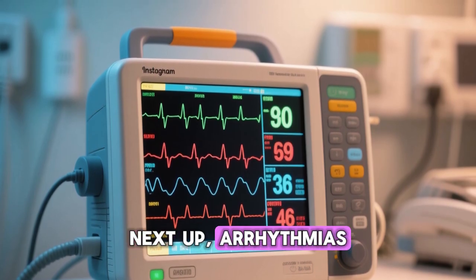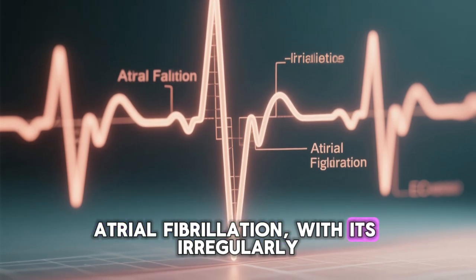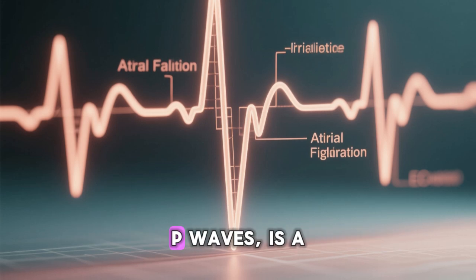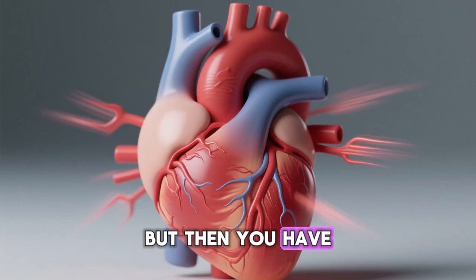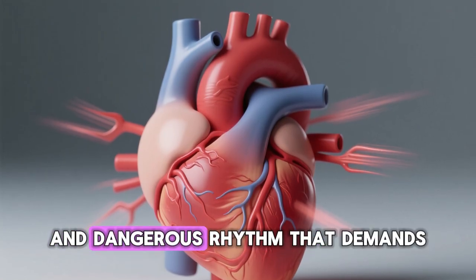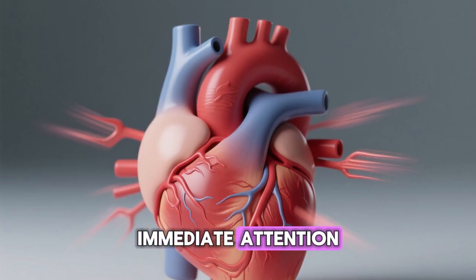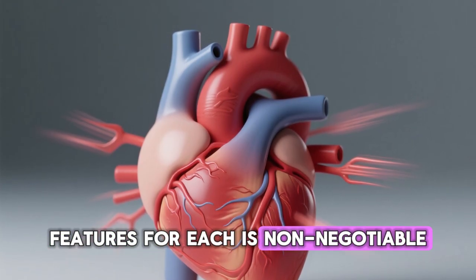Next up, arrhythmias. Atrial fibrillation, with its irregular rhythm and no clear P waves, is a common one. But then you have ventricular tachycardia, a wide, fast, and dangerous rhythm that demands immediate attention. Knowing the key features for each is non-negotiable.